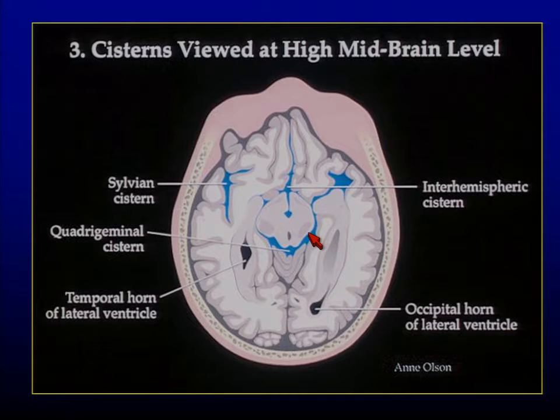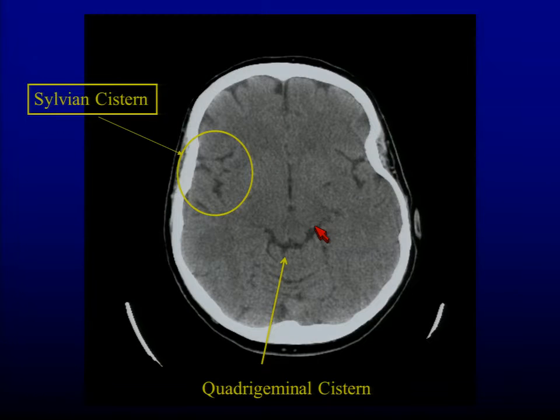The other thing that can happen there is venous subarachnoid hemorrhages from rupture of venous lakes that happen in this region of the midbrain. It's a benign cause. You treat them like every other subarachnoid hemorrhage because you don't really know that until you've done all this stuff. But when somebody has only subarachnoid hemorrhage back here in the quadrigeminal cistern, that's a good sign. If I have a subarachnoid hemorrhage today, I pray it's one of those because those generally get better. You don't have to do anything. You don't have an aneurysm. And importantly, they don't get into vasospasm.